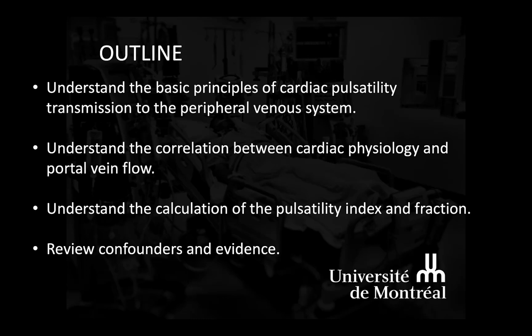At the end of this video, you will be able to understand the basic principles of cardiac pulsatility transmission to the peripheral venous system, understand the correlation between cardiac physiology and portal vein flow, understand the calculation of the pulsatility index, and review confounders and evidence.